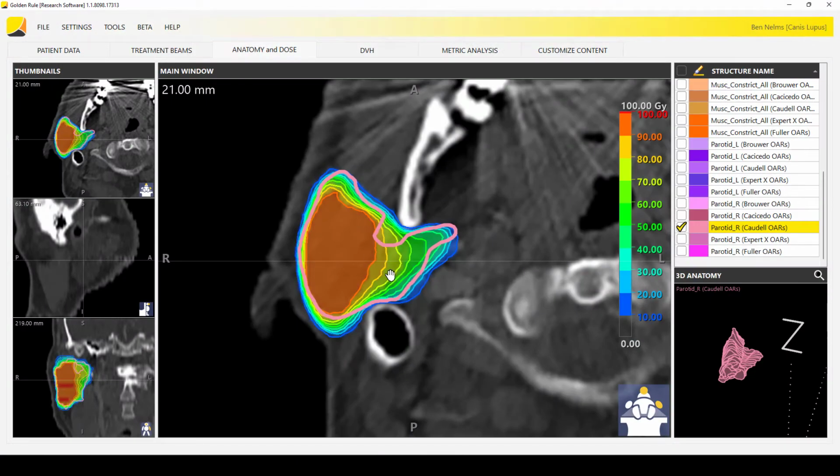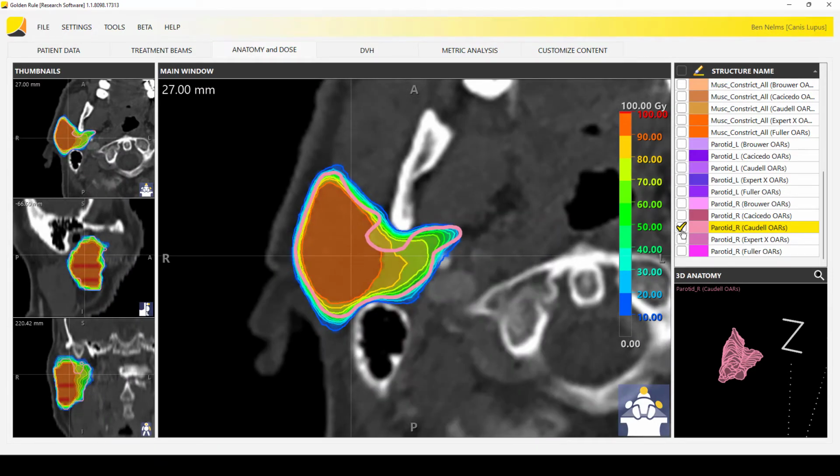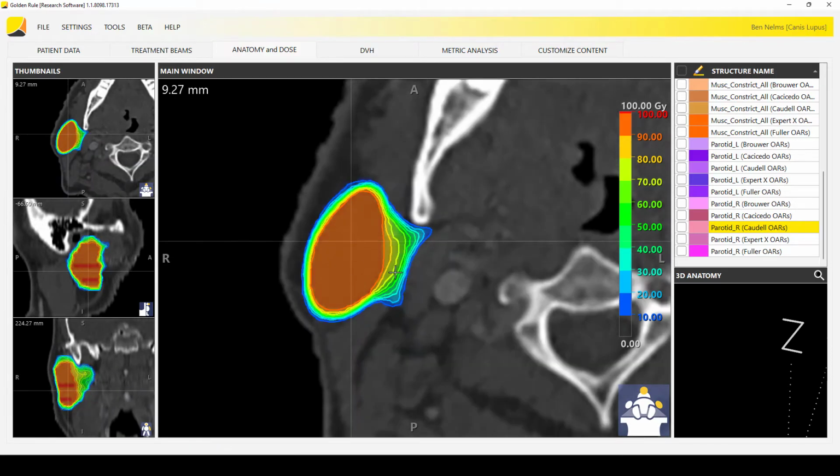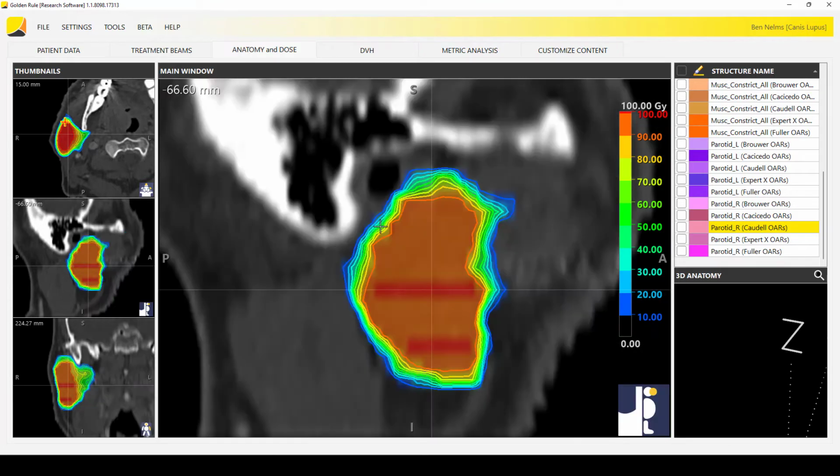And now let's look at the regions of agreement and disagreement. Probably going to be similar trends to what we saw earlier. One little artifact here you can see in the sagittal: it looks like someone didn't complete their contours or forgot to interpolate, because there are missing slices in there. So really we just pay attention to the orange, 90%. We can not worry about the 100%, that's going to be sensitive to errors like that.